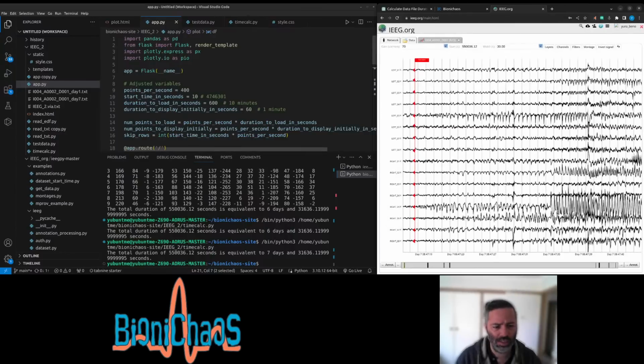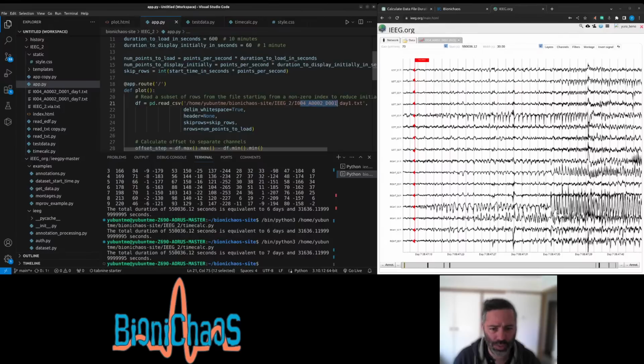So we have this file. Yesterday we were essentially opening day 1 of this dataset. It's on iEEG.org. I think anyone can register and view it like this. There's also Python and MATLAB scripts for actually downloading this data.